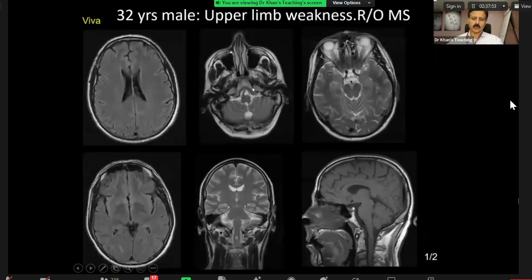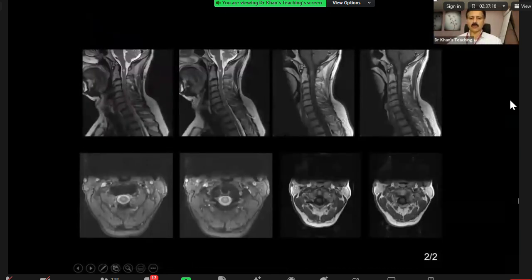The point of showing you this case is what I call an edge of the film case, again a favorite in the exam, where you are being shown an MR of the brain and the pathology is either in the head and neck or, in this case, in the cord. So you pick up something there, and then you ask for dedicated imaging. Instead of giving a differential diagnosis initially, and this is what happens in the real world also, the first thing is dedicated imaging, and particularly contrast is critical here. So you give contrast.